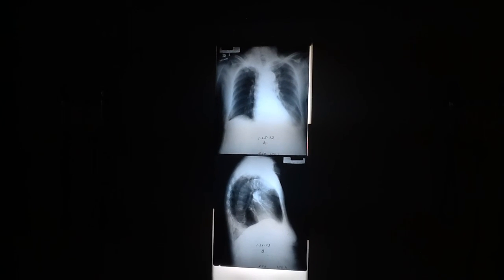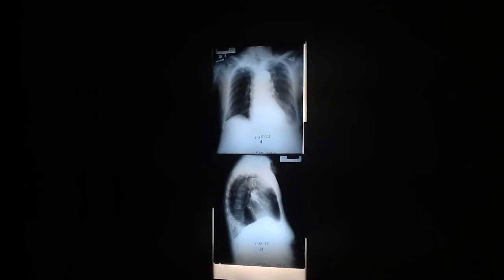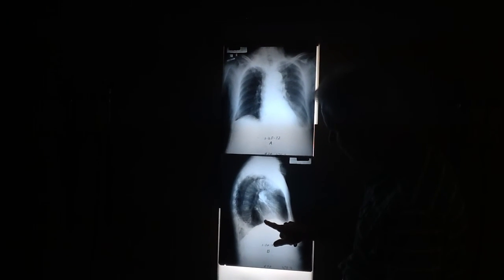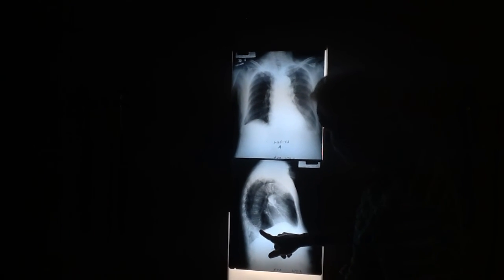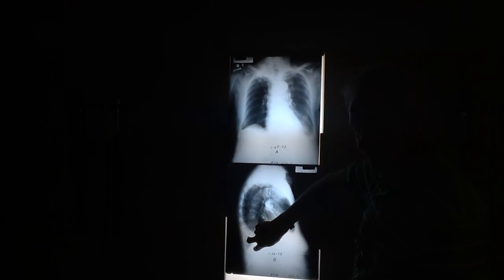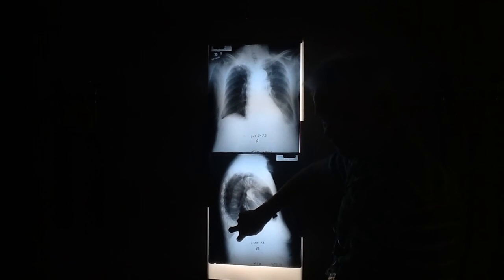On the bottom view here, what were you saying about the diaphragm going up? Well, if this was part on the right side, then this is gonna come along like this. It's gonna hit the fluid, which would be touching it, and the density's gonna go right up, because the effusion would silhouette the right hemidiaphragm if it was on the right side. Okay, got it.